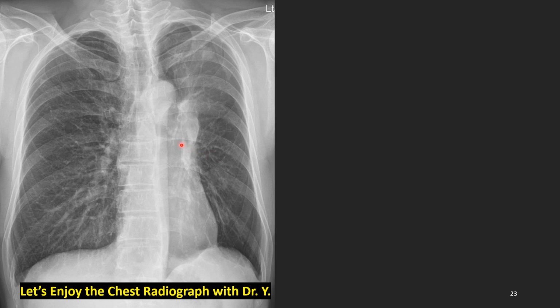And there is something more here. In distal left main bronchus, there is something blocking here. Yes, left upper lobe lung cancer.